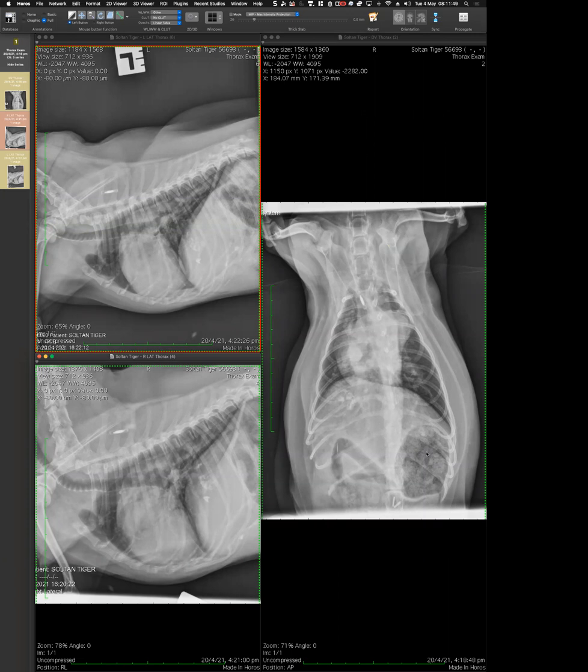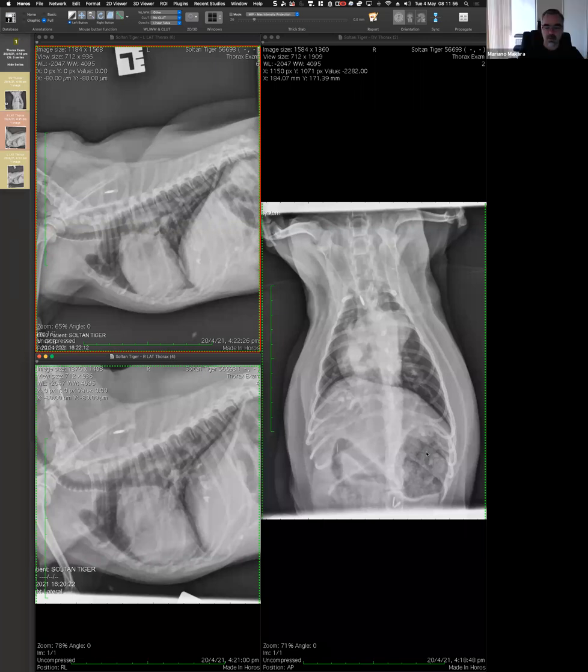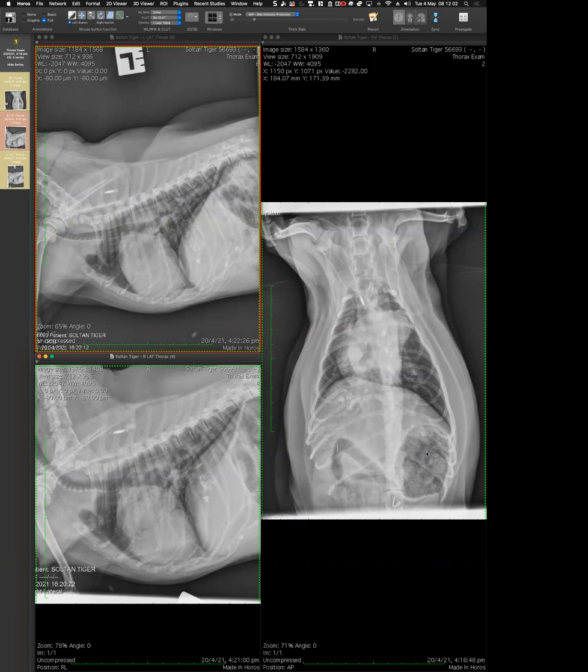I can't draw. Well, you could, like a minute ago. Okay, well, I don't know what I did. So I've got, well, draw, got a line. Try that. No, hang on. There we go. Okay, there we go. I think there's there, and I think I can also see it here on the left lateral. This looks like a cavitated something.